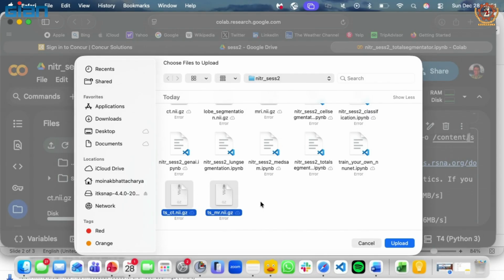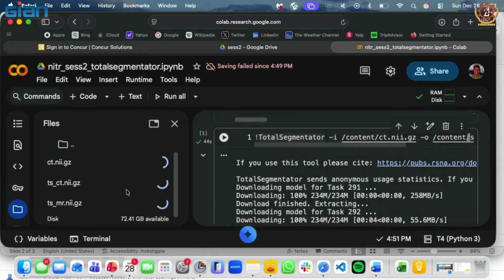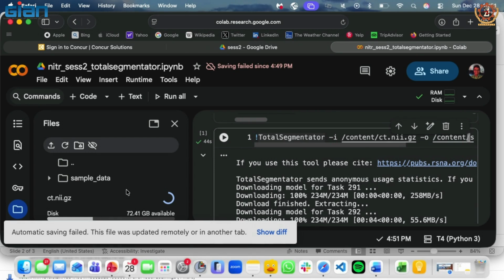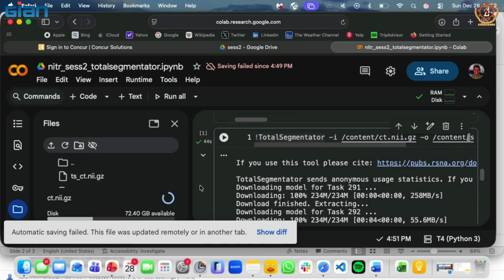So now we are going to use that, which some of you were visualizing by mistake. For those for whom the segmentation is already done, just save that to your computer. To save, click the three dots, and then there will be a download option. Just download it. It's not there? Oh, what you can do is zip it and upload.